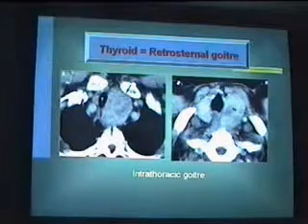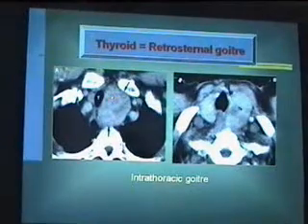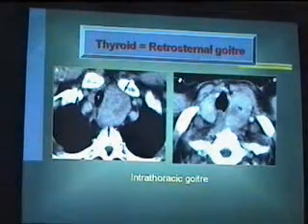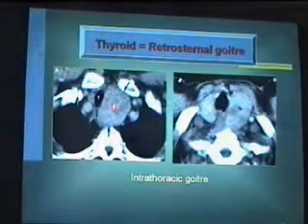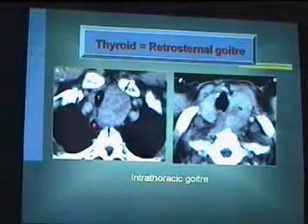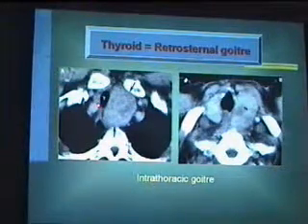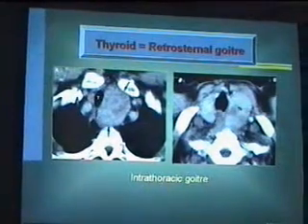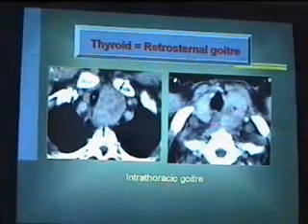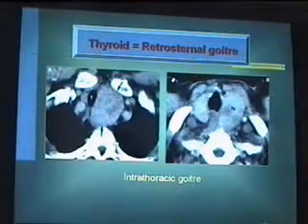وده المنظر. That's the thyroid, that's the region of the sternum, and that's the retrosternal extension. شايفين الثايرويد واصله لغايه الفرتبرال column. يبقى definitely it has to compress the esophagus. What's the esophagus? اهي displaced وbowed, and this is the trachea is narrowed and contralaterally displaced. Okay? That's another thyroid here. دي previous following image بتاعتها. وادي المنظر بتاعها after contrast injection takes up contrast.